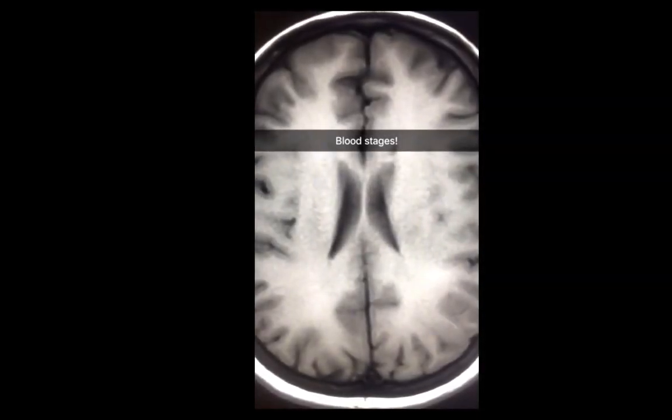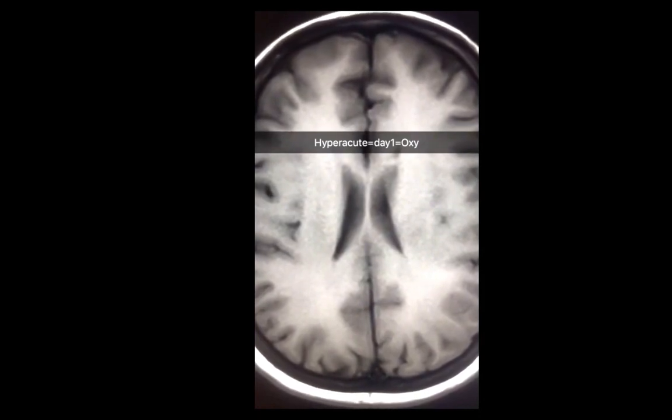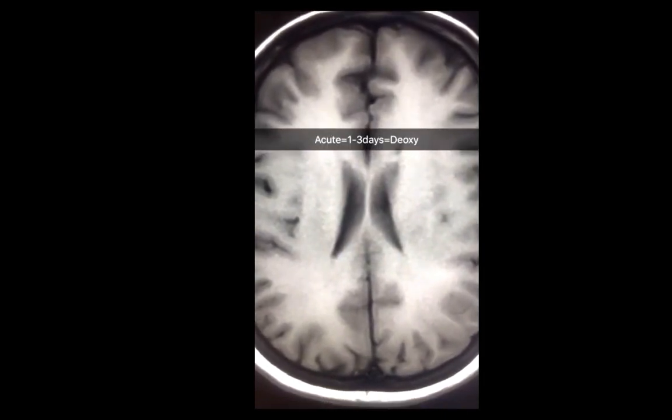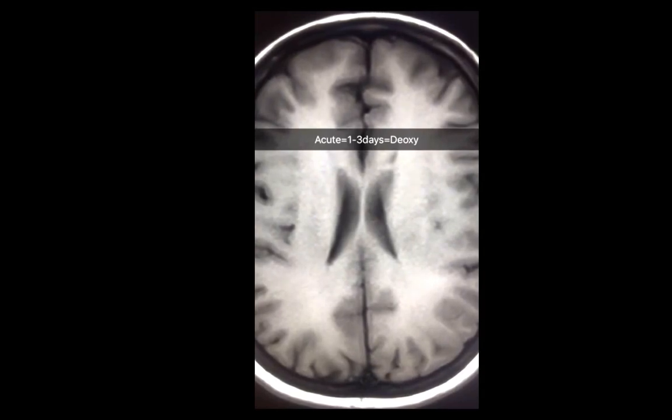Bleeding has various stages which may affect the appearance on MRI, and this is the reason to show this case. Hyperacute blood occurs within the first day and is mainly composed of oxyhemoglobin. Acute bleeding occurs within 1 to 3 days and is mainly composed of deoxyhemoglobin.